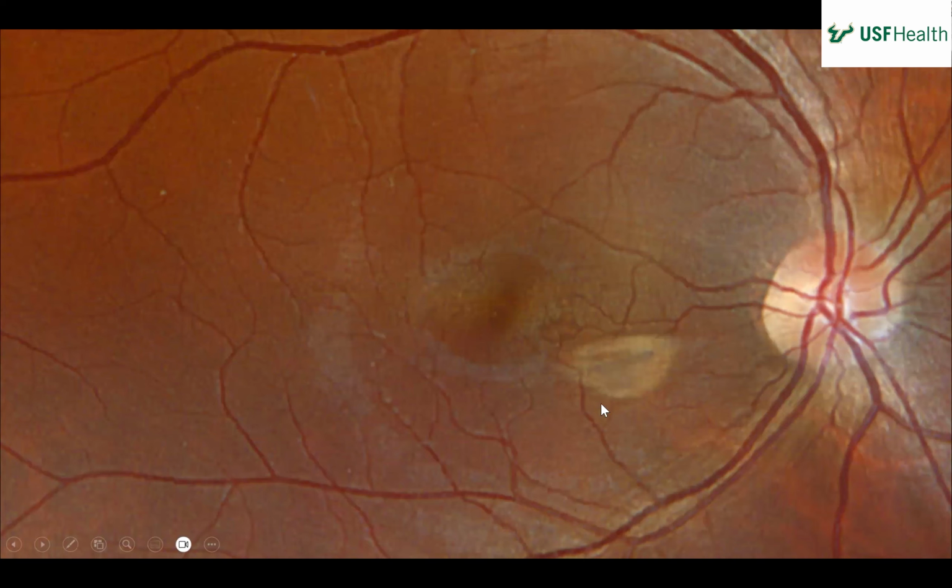And then what level? Can you tell? It's kind of an interesting lesion in that you can almost tell the level. You guys know why it's confused about this area, this diameter?